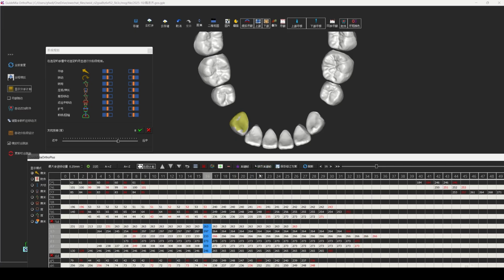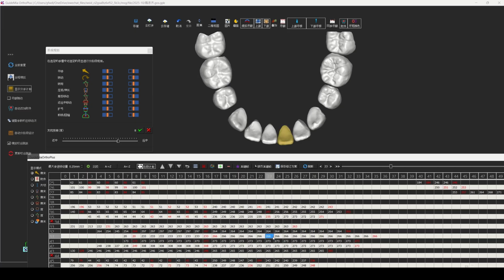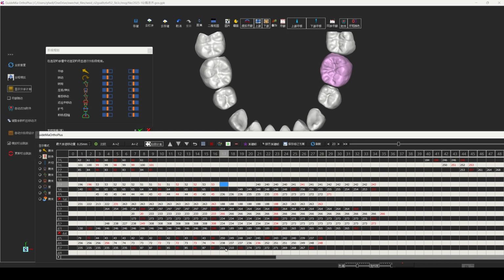Then a few steps later, in step 23, we define another keyframe and we align the keyframes again. So this way, step 16 and 23 will be serving like a checkpoint. So at those steps, the anterior teeth are roughly aligned. Then we further do drag and drop for the posterior teeth. So again, we don't have to move too many teeth altogether.